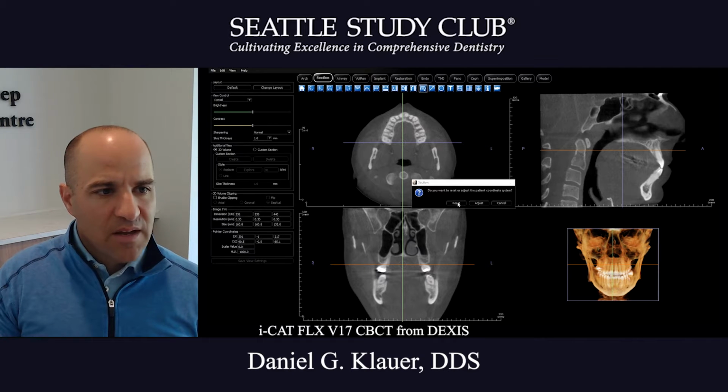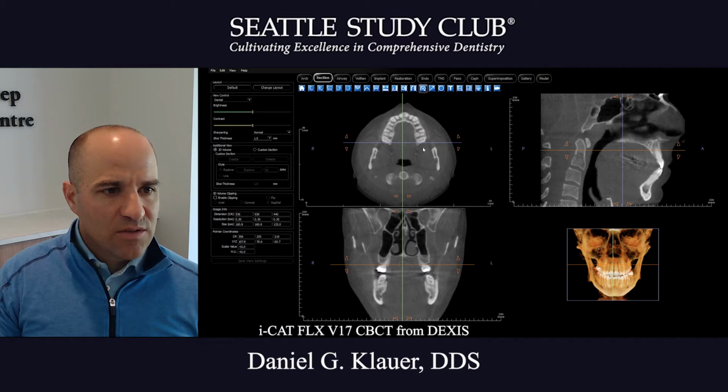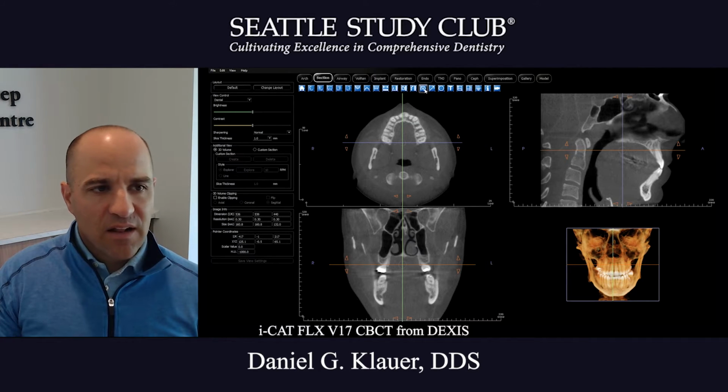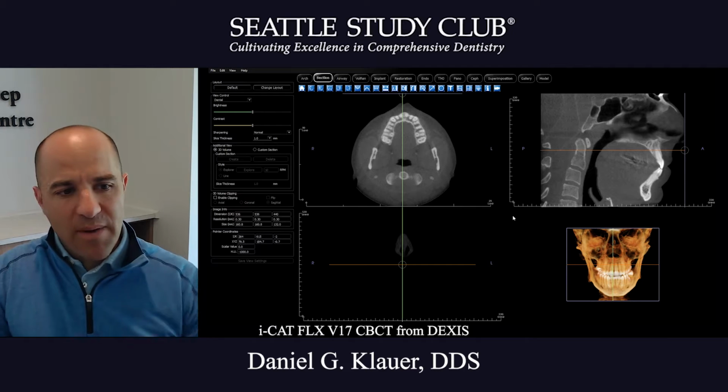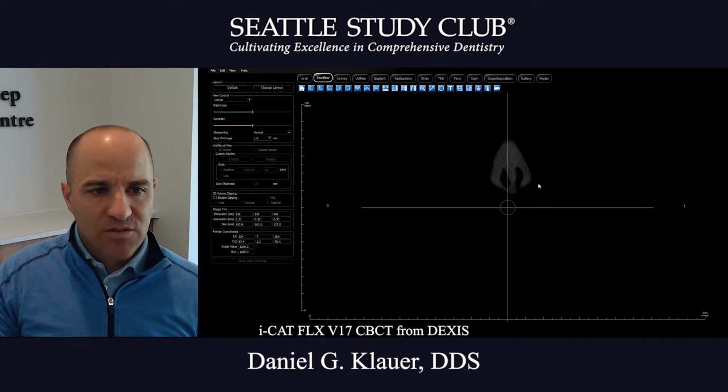We'll hit the orient button, and that allows us to center the scan if needed, depending on the patient positioning. That allows us to make sure that things are level and on plane. Then typically, I'll start at the tip of the nose and work my way back. So I'll just zoom in here.